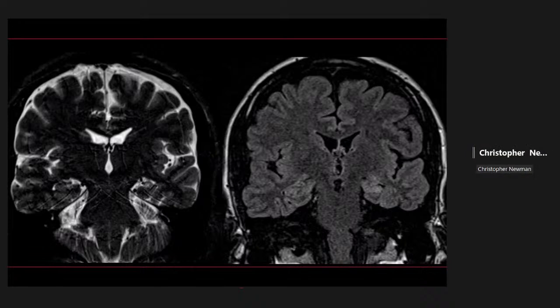This looks like the normal S shape. Yep. So, I don't know that I see anything that's necessarily specific to this case that leans me out of the normal mesial temporal sclerosis discussion, though. It doesn't look too atrophic compared to the right. It's mostly just the architecture and the signal.